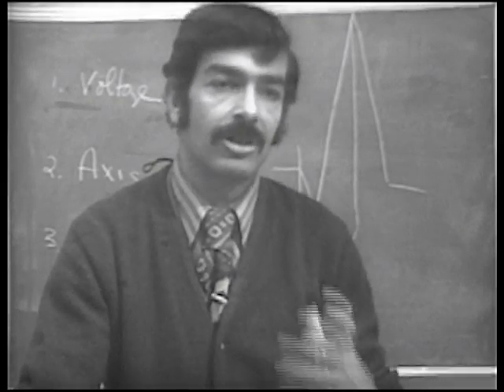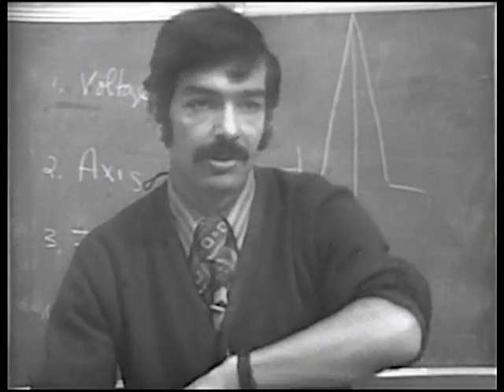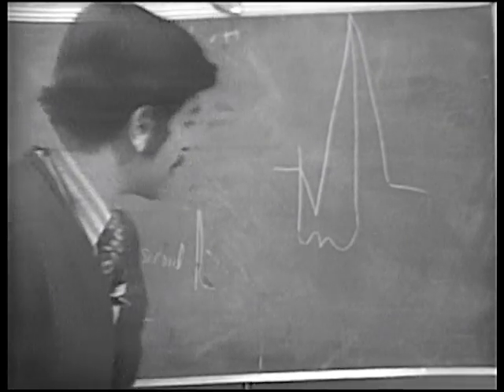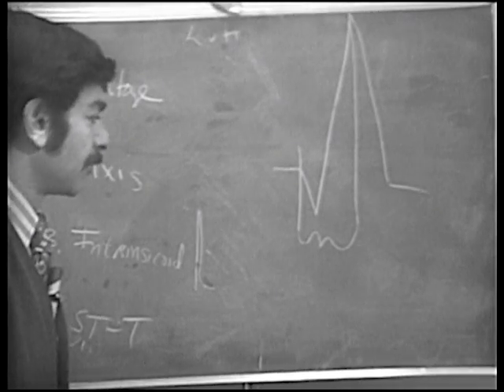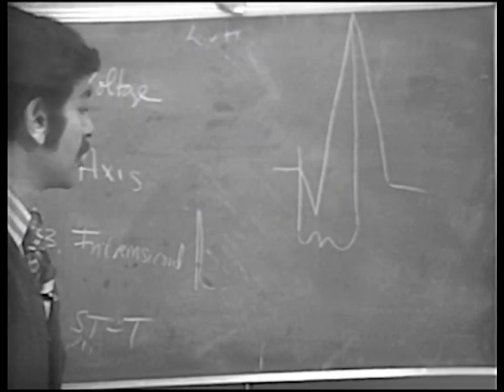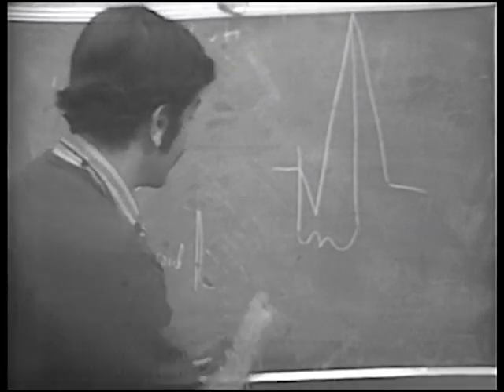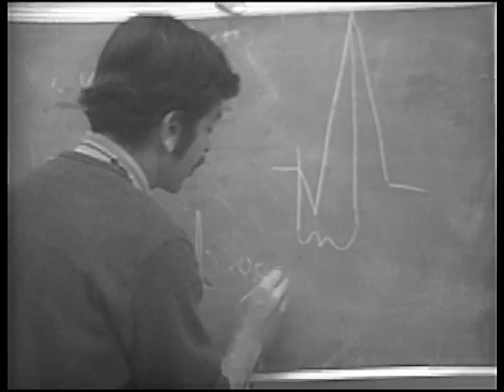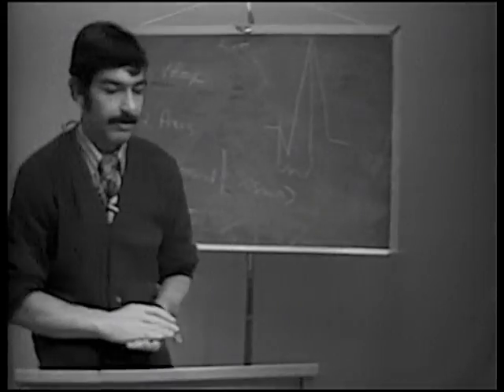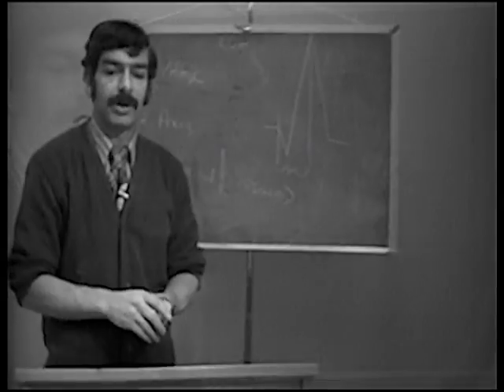Probably with thicker muscle, there's some fibrosis and some terminal conduction disturbance, and it takes a little bit longer to get out to V6. That's thought to be the probable reason for the prolonged ventricular activation time that you occasionally see with LVH. Okay, so this duration then should be 0.05 seconds or greater in order to make one of these criteria for LVH, 0.05 seconds or greater.